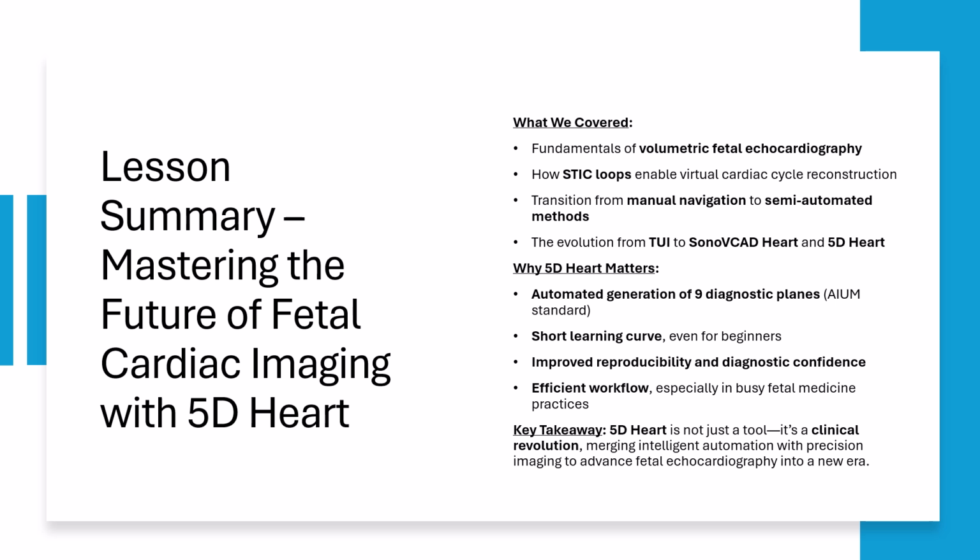And it radically boosts workflow efficiency, especially crucial in high volume fetal medicine settings. The key takeaway, 5D Heart is a clinical revolution, bringing together intelligent automation and precision imaging to push fetal echocardiography into a new, smarter era. Thanks for staying with us through this journey. The future of fetal heart imaging is already here.